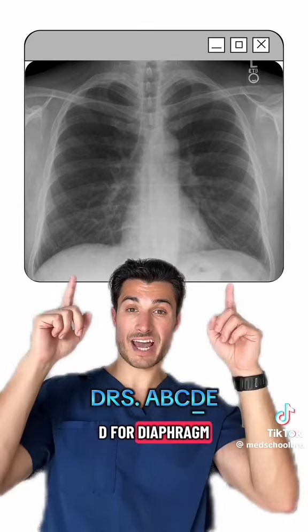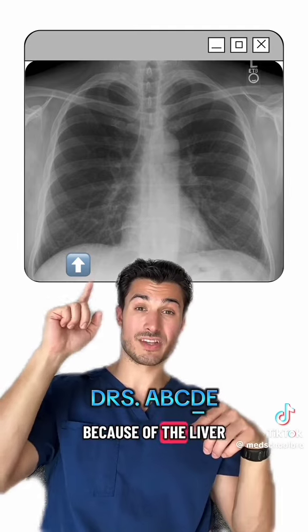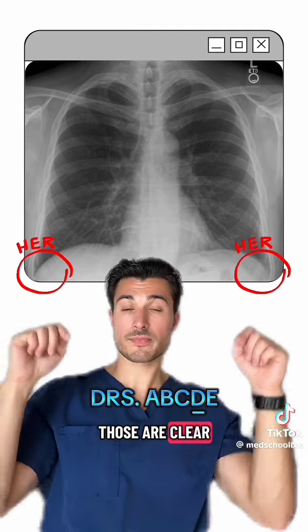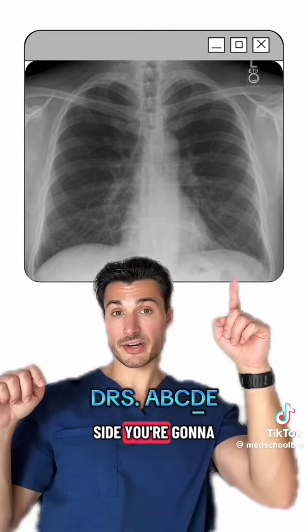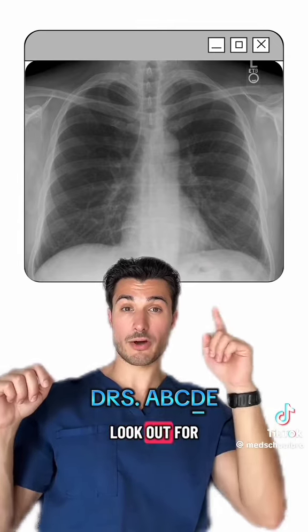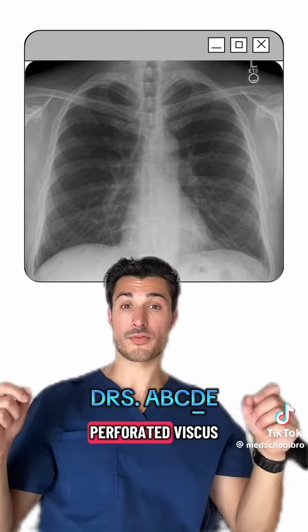Next up is D for diaphragm. Now the right hemidiaphragm is actually higher than the left, and this is because of the liver. I want you to look at the costophrenic angles, making sure that those are clear. I want you to notice that on the left side, you're going to see this gastric bubble, which indicates the stomach. And I also want you to look out for air under the diaphragm, which is a bad sign, as this can indicate perforated viscus.